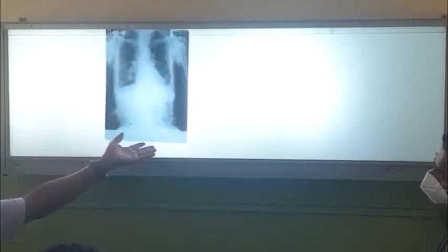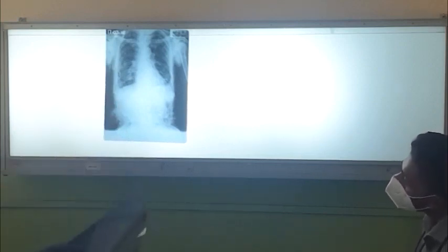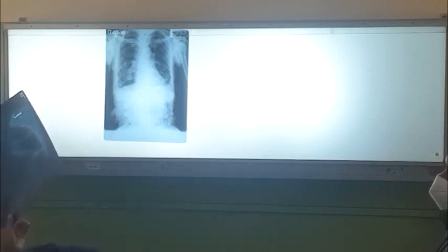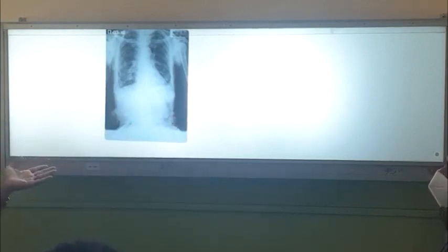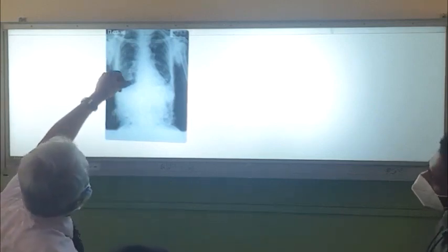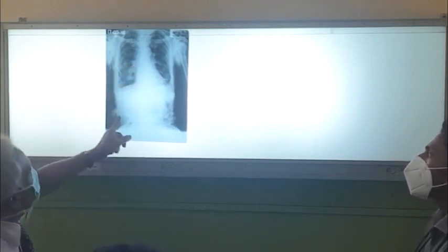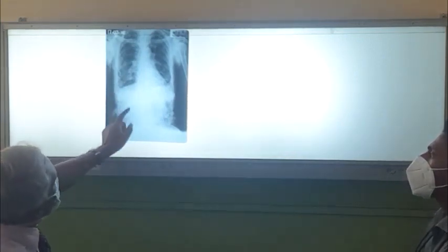These are spot cases for you, right? Sometimes you might get this. What is the diagnosis there? That is why I am keeping these X-rays. What is the diagnosis? Oh, because you see rounded lesions here also. This is neurofibromatosis, right? A neurofibromatosis patient can present with lung fibrosis. So it's pleural thickening, basal opacity suggesting lung fibrosis. Poor quality X-ray anyway. So thinly built patient, right? Everywhere you can see these pedunculated lesions.